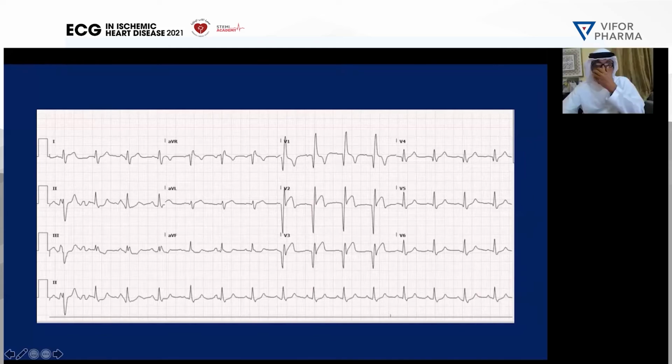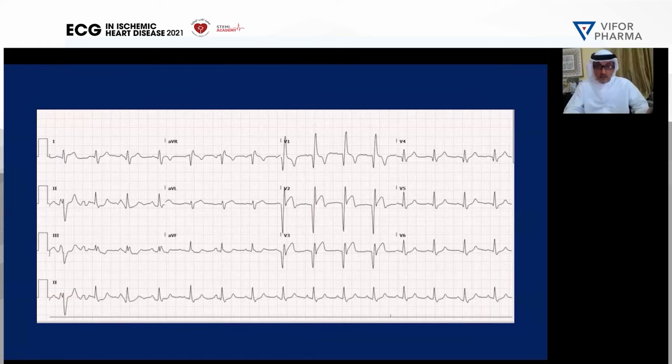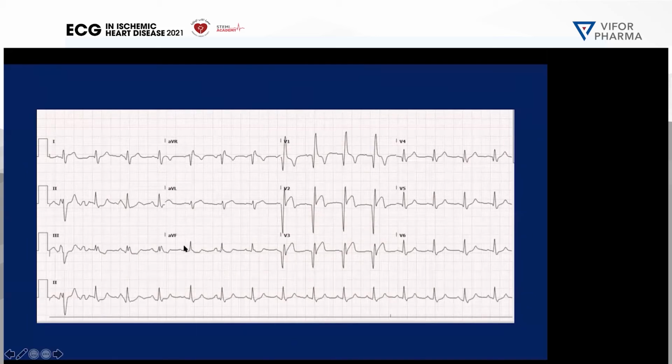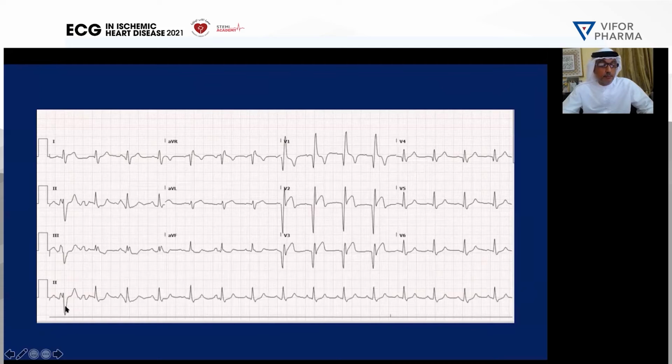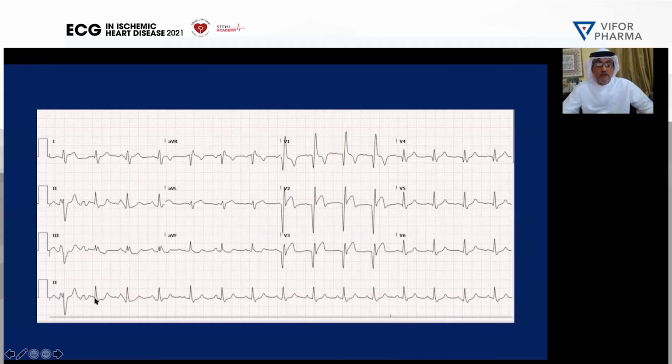Yes. Rhythm: look at the rhythm. I want every one of you to look at lead 2 down. What is in lead 2? Raised, yes, P-QRS complete, but in the first beat you see there is a premature ventricular beat falling in the dangerous period also. Yes, Zubaidi, what do you think? Sorry, I missed that one. I'm saying look at lead 2 down, the first beat in lead 2. Yeah, I think there's a ventricular ectopic beat. Yeah, and then we have a sinus rhythm that marches regularly, but there is already a PVC, as we saw in the previous ECG.